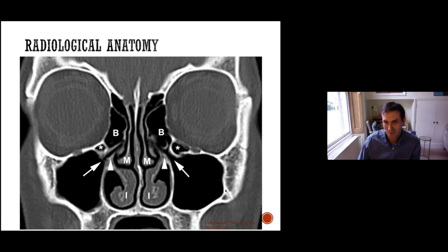So what have we got? We've got M is middle turbinate. Eduardo Prades gets the prize for the haller cell. Infraorbital, Alexander as well. Yeah. Okay. Good. Good. Excellent. Right. I think you're identifying some of those structures. That's excellent. So let's get on to the next slide.